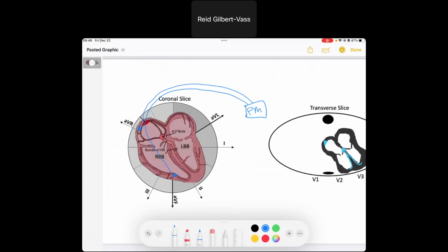And so there's a bunch of different modes that this pacemaker can run on. But in this case, remember our EKG, we had normal P waves, okay? So the sinus node fired off and caused the atria to depolarize. And when it depolarized, this atrial lead sensed it, and because of that, it was inhibited. It doesn't need to fire.